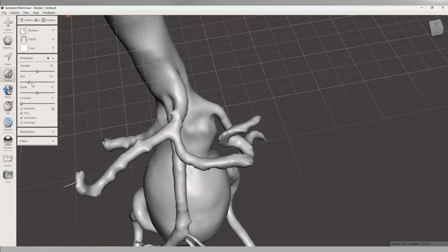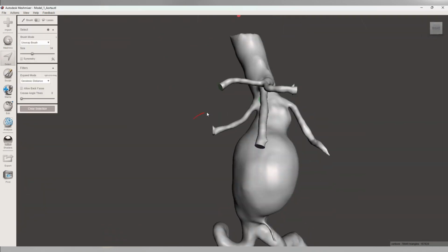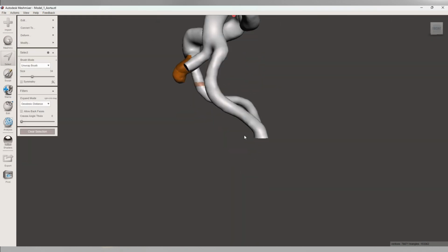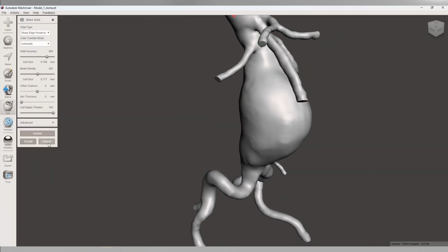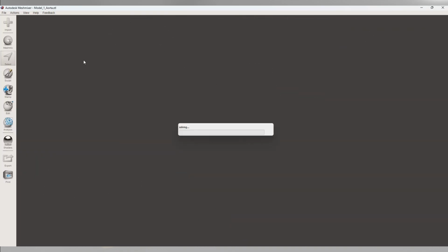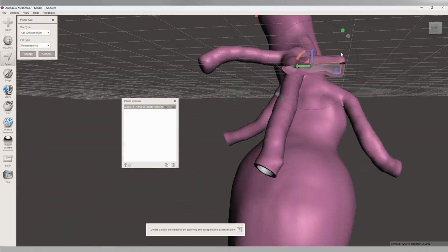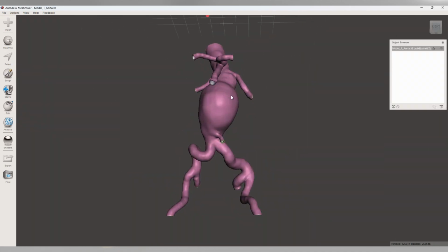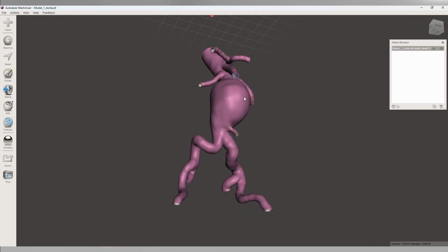In an endovascular procedure, the inner lumen of the vascular structure is used to guide the catheter to the aneurysm. Therefore, the model must represent a hollow vessel. The segmentation only provided us with the lumen as a solid object, which is now to be transformed into a hollow object by adding an additional shell. To fulfill the requirements for a durable and long-lasting training model, we added the additional shell with a distance of about 1.5 millimeters.